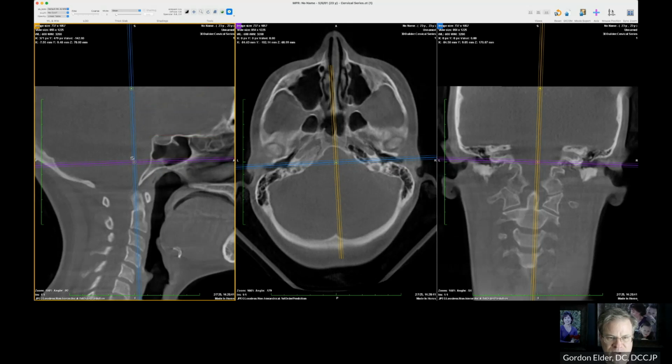That's the other spot I'm going to do. Otherwise, all that information just stays there, cluttering up your view. So I'm not going to do the very bottom one. I don't really need to. And okay, now you notice they aren't exactly on the lines. Don't worry about that yet.